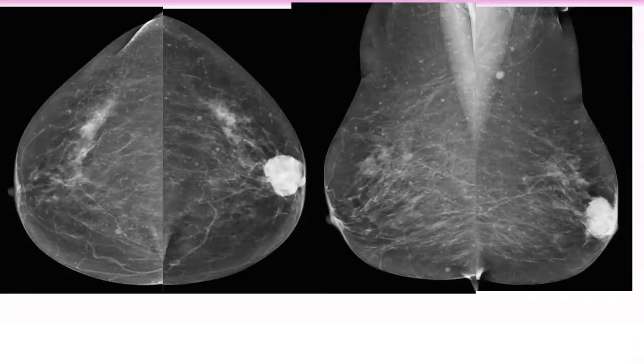What about the distribution? They are diffusely scattered bilaterally in both breasts, and even the axilla. Maybe they are just artifacts. I told you no artifact. They are real, seen on ultrasound.